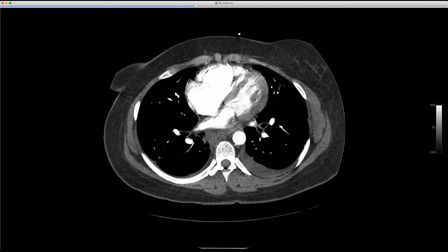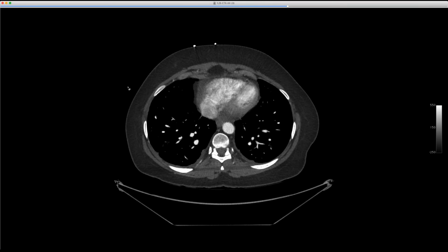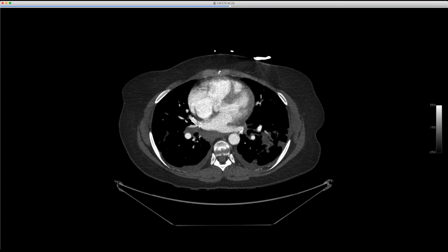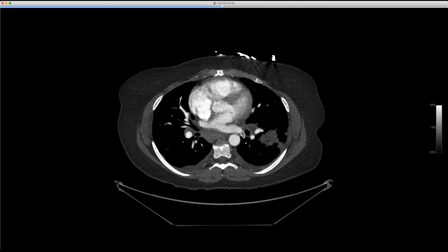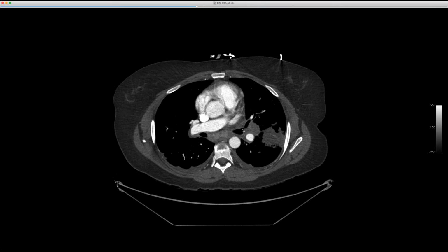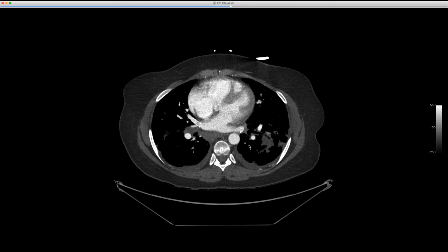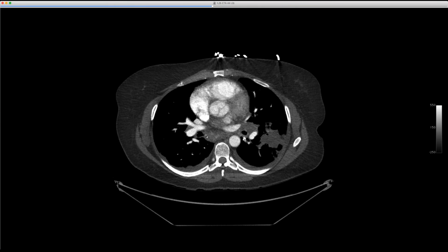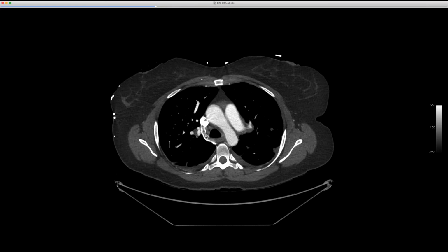So before this patient got into too much trouble, they actually were able to stent these veins, some of them. So you see they put a stent in on the right superior, left inferior. Not great flow inside that stent. You can see it's pretty tight, and they're still pretty tight. It still has the pleural effusions and some other stuff going on there. I've seen a few cases of sarcoid do this. And I have one on my server that's from Howard, so he had one case as well. I didn't download that one though.